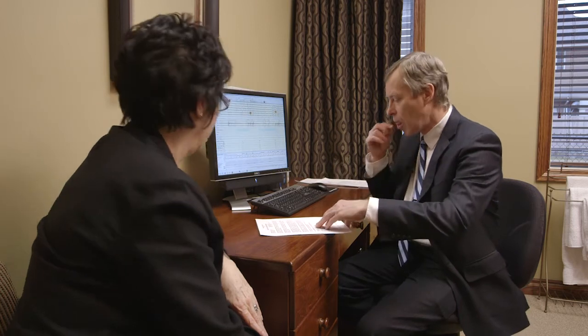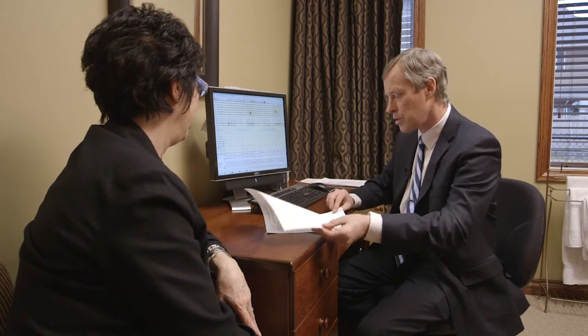So altogether, you woke up to breathe about 89 times, and that works out to about 12 times per hour of sleep. So if we see 5 or less, that's considered in the normal range. 5 to 15 is considered mild sleep apnea, so 12 is in the mild range, you're mild. 15 to 30 is moderate, above 30 is severe. So it's mild, but it's still significant. In other words, it's still going to affect your sleep quality and make you a little bit tired, and so it's worth treating.